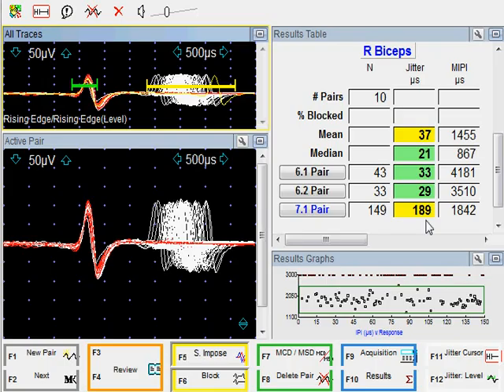So we have now reviewed all of our recordings. We have looked at different features. Let us look at the summary results.